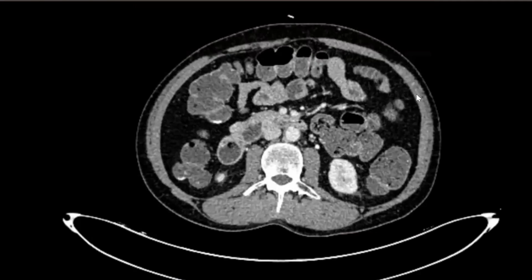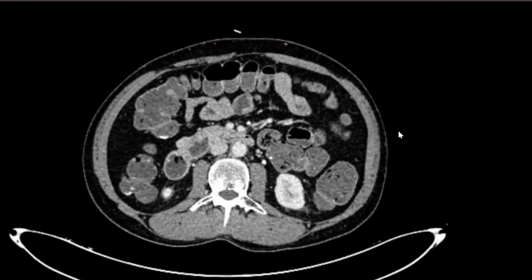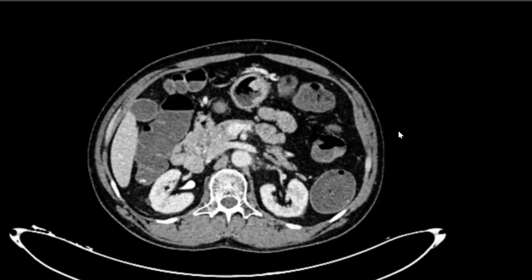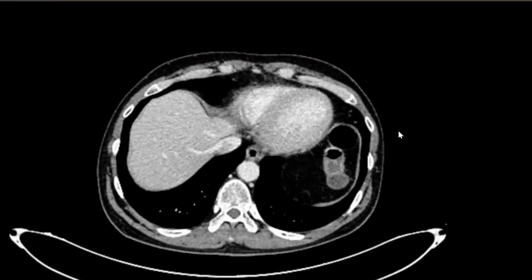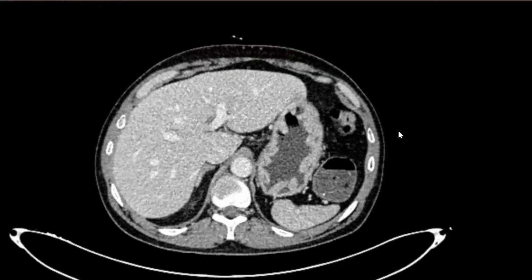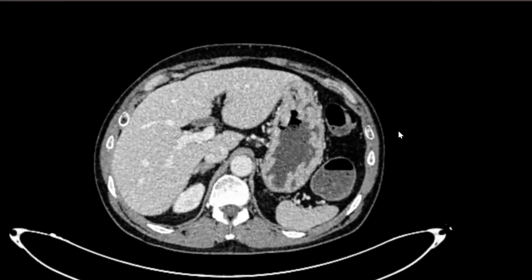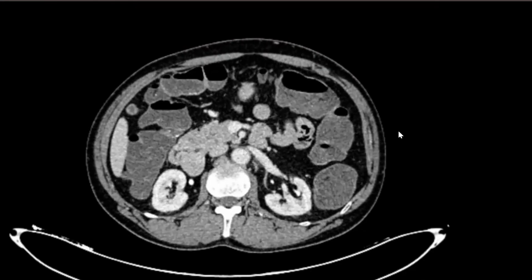Okay. A 45-year-old male who presented with abdominal pain. So I think you got a bit stuck here with the findings. I tried to prompt you towards the finding, and then you were able to pick up some of the findings, that there is gastric rugal fold thickening. You were correct to point out that it is hyper enhancing and that you are thinking along the terms of Menetrier's disease, right? You also pointed out that since it is involving the first part of duodenum, you will also be thinking in terms of peptic ulcer disease.